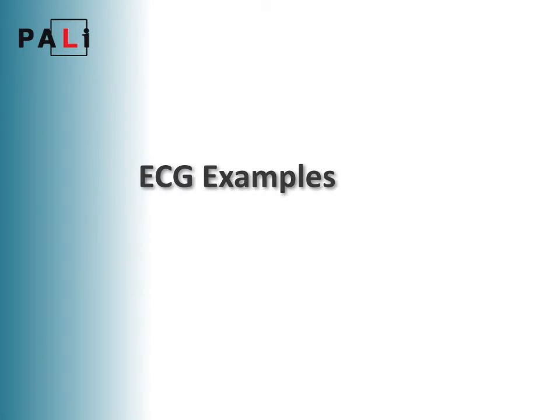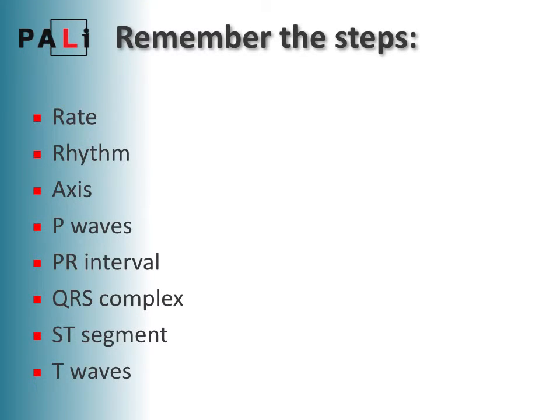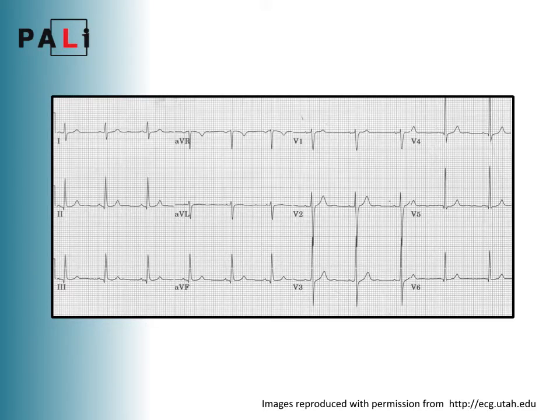Now we're going to run through some examples of some ECGs in clinical scenarios. So it's important to remember the steps and to refer to this slide if you're not sure how to interpret it. So first of all, we'll look at this ECG.